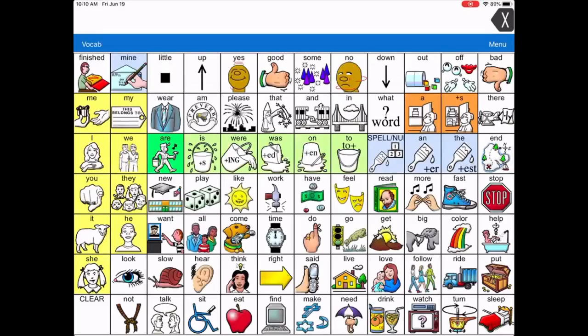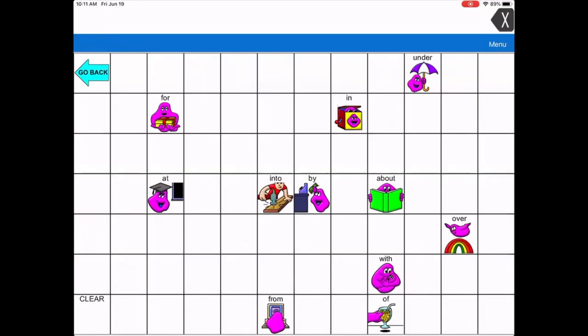The next big button that brings everything together and helps the transition of language is the preposition button. And that is the bridge that is bridging two different worlds or two different lines together. And if you click on that, it gives you more options, and you can click on the cloud objects that can go on, below, through the bridge. And these are the prepositions that help us communicate.